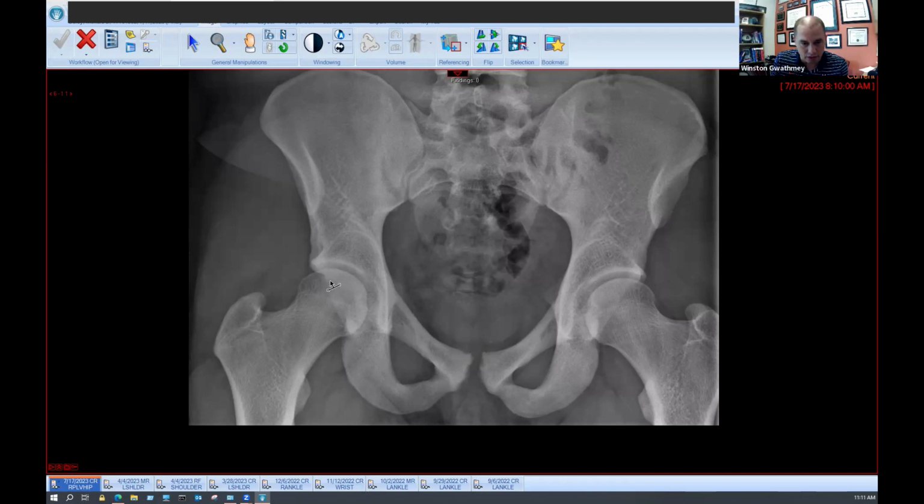So if you think about it, the right hip is a little more anterior than the left hip, that would magnify the left hip crossover sign. It would undercall the right hip crossover sign. Additionally, if you want to measure the tip of the coccyx to the pubic symphysis, make sure it's somewhere between 1 and 3 centimeters. This one's right at about 3 centimeters, so it might be a little bit inlet, which again would overcall the crossover sign.